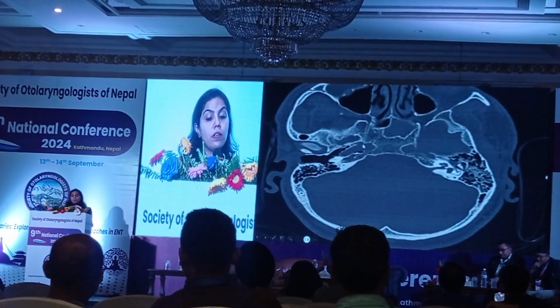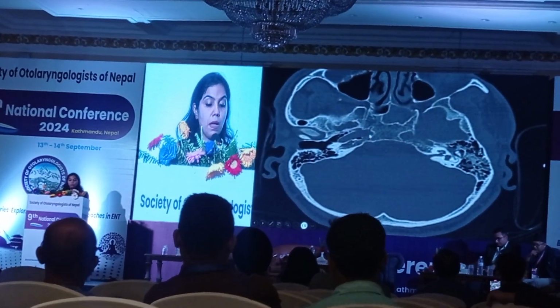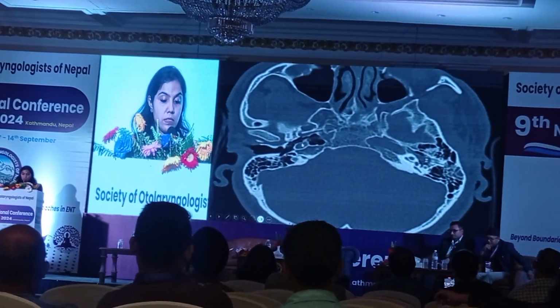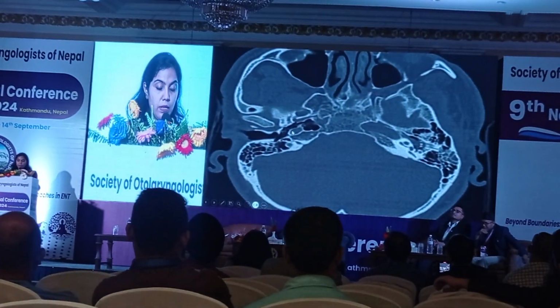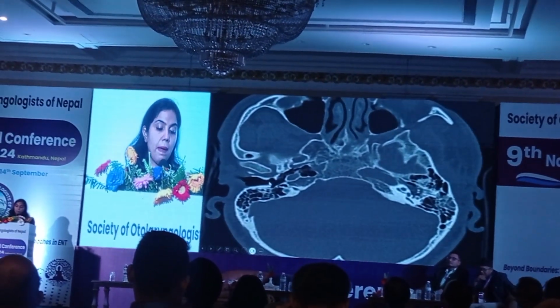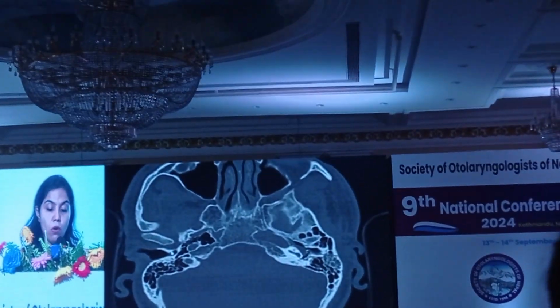As I move further, I see the carotid. The carotid is coming into the view, and further down, the carotid is getting narrowed down, and this is my tympanic. This structure is my tympanic membrane, and this structure is my external auditory canal.